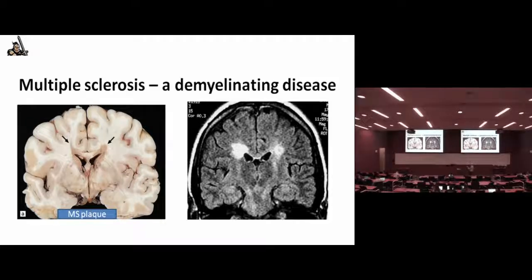And here is a scan of a similar patient, if not the same, in which, and this would again be a flare, because, well, when you can see the ventricles are black, it's either a flare or a T1. Generally, you know from what it says, and I think this says FL, I think that's part of flare. And flare just looks a little different than a T1 in other ways. But I think this is a flare scan in which you see the pathology here, and you see it very distinct from the ventricles, but very near the ventricles.